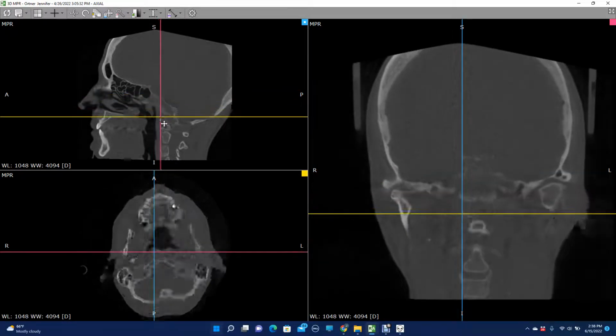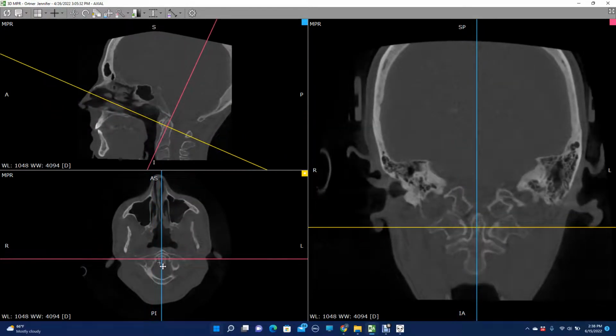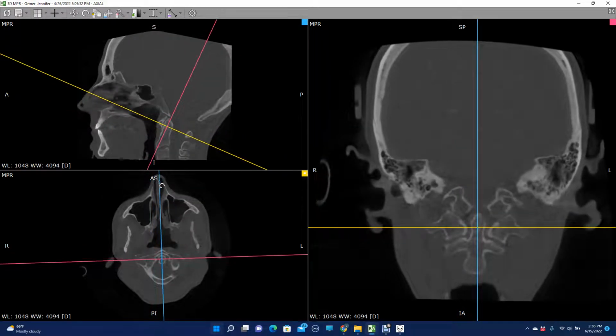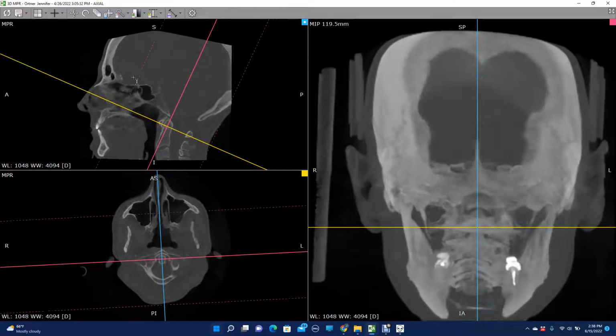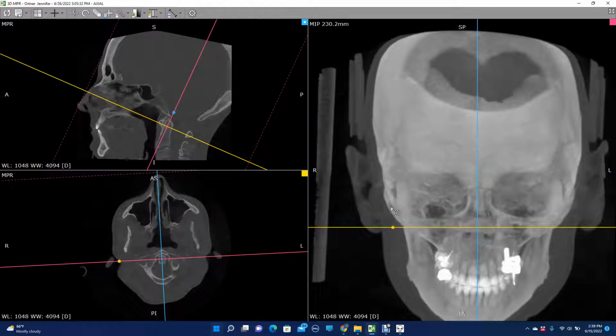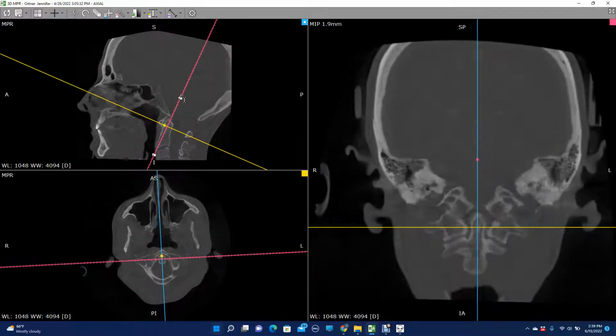And so if you wanted to shoot an x-ray down the sagittal plane line of the atlas without head rotation, this is how you would do it. And when you position those, now we have a normal frontal looking x-ray. And the atlas is right there. That's how we would typically be assessing that. And so we're going to take the rules of traditional analysis and start to apply it to 3D and then measure things.